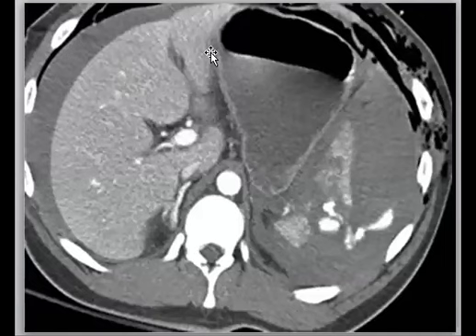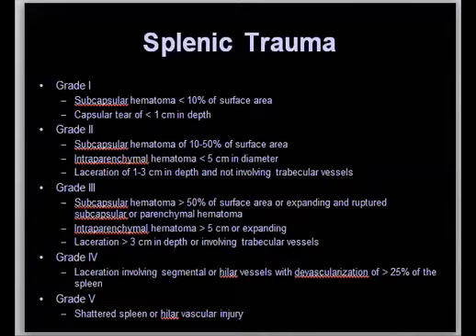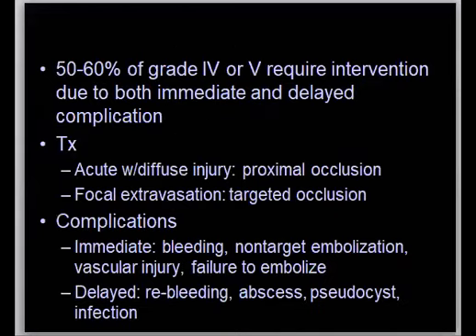And more important than the surgical emphysema, the patient has pneumoperitoneum. Any patient with trauma, look for pneumoperitoneum first. Trauma is liked in the exam because it tests the basic and emergency requirements.